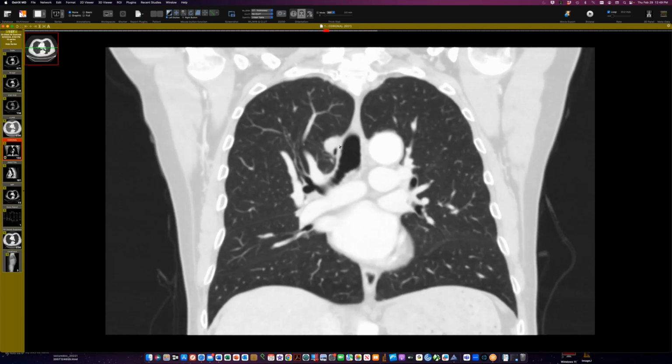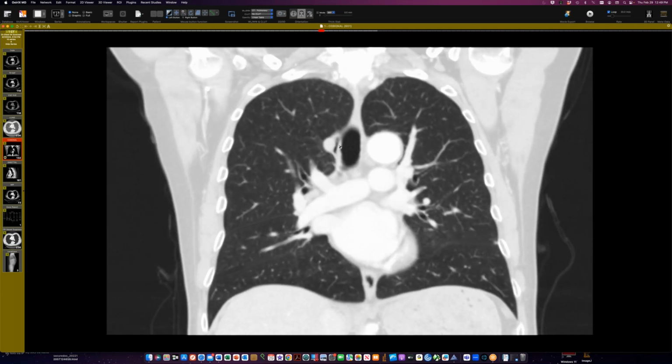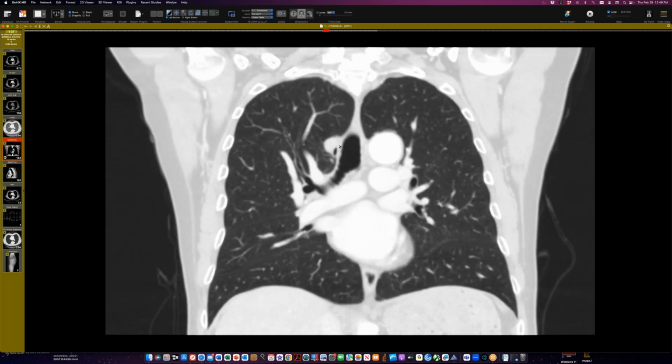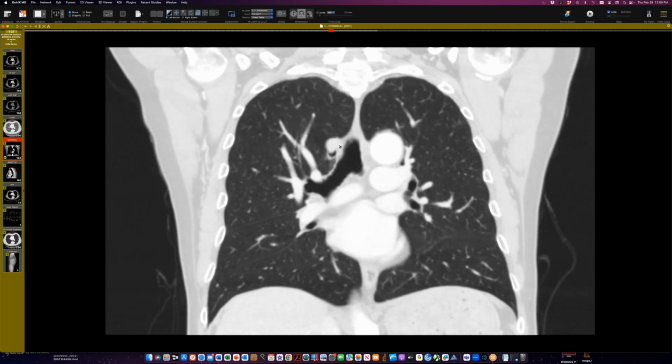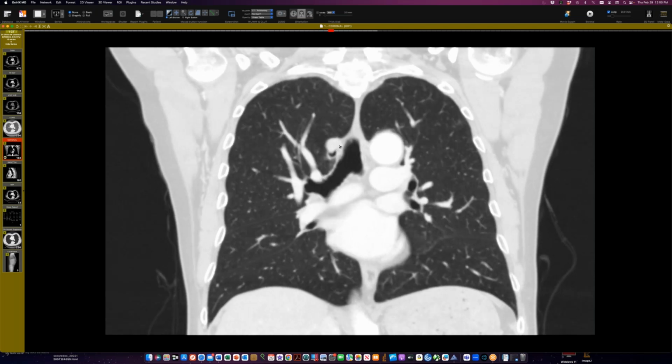Have you, Jeff? Yes, I've seen a few, and I've seen what I call an aborted tracheal bronchus, where it looks like a diverticulum right at the azygous vein, and then it just ends blindly. But I've seen several of these tiny ones loop under the azygous arch, and then they have varying degrees of obstruction because of all those acute angles. Yeah. Okay. So this is a teeny weeny one, and it does have that nice relationship to the azygous vein there. Yeah, I'm glad you pointed that out.